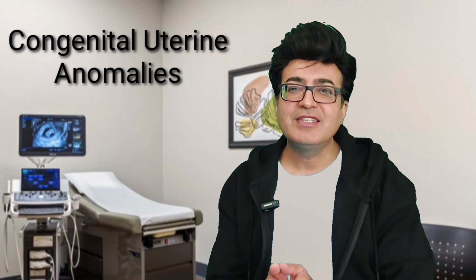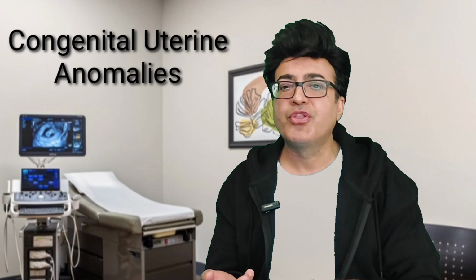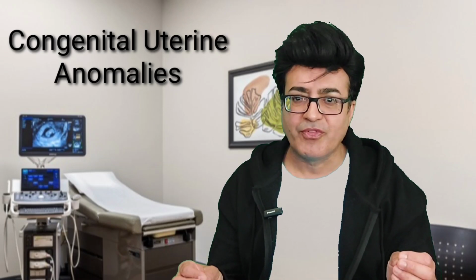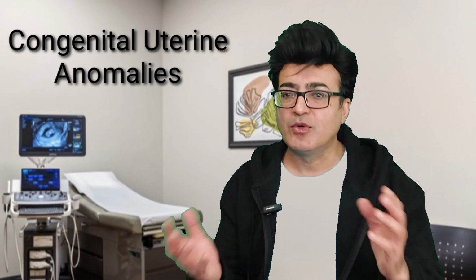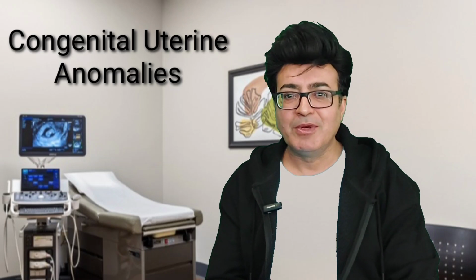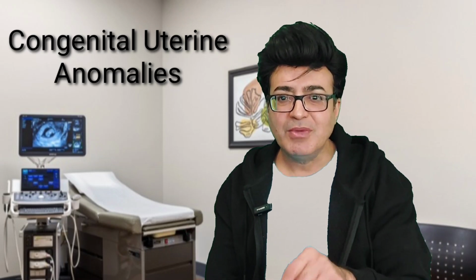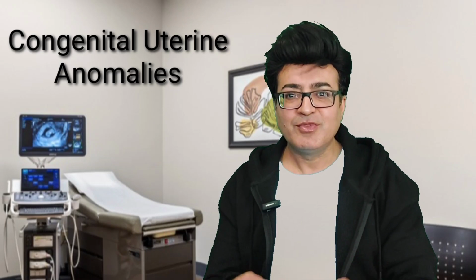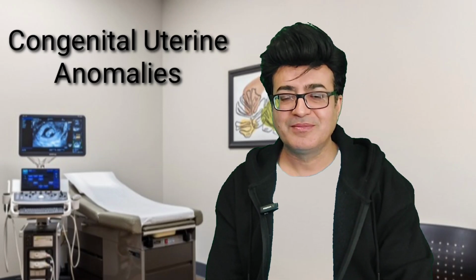So I have collected some of the images. These are ultrasound images and 3D images. Hope this will help you identify some of the abnormalities, and you will be able to figure out what this is, and you may be able to get your head around all these abnormalities. So keep watching this video, and I'm sure to some extent it will definitely help you. So let's start watching these images.